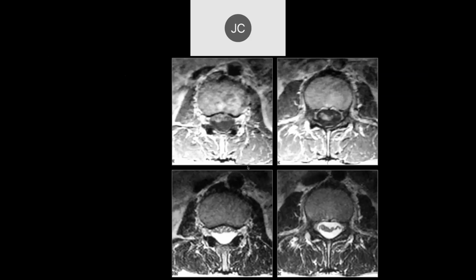And here on the axial images, what do you see? Right, the nerve roots are not in their normal formation. So we used to call this clumping of the nerve roots. Right, okay. Does anybody know what that means? Arachnoiditis. Okay, good. And this was thought to be secondary to the injection. And they call it clumping, right?